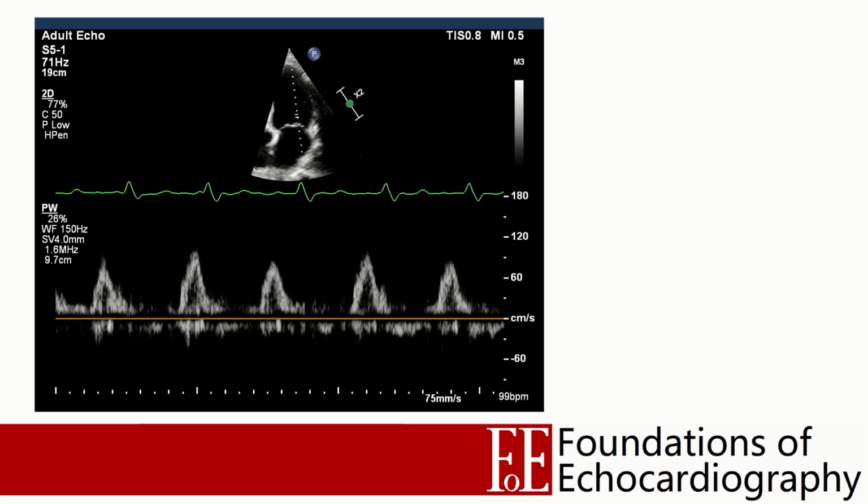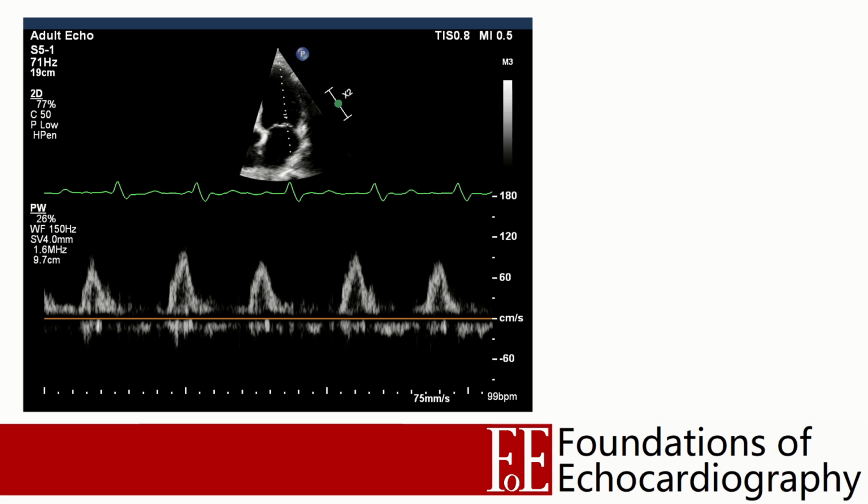In addition to losing slower speeds, we might also be missing greater velocities. If our intention was to detect the fastest velocity that occurs, then if our sample volume is not in the perfect spot, we might miss it. As a general rule, when your priority is to know about the speed of blood in a specific location, then you should use pulsed wave Doppler. When your priority is to identify the greatest velocity, irrespective of where it occurs, then you'll wish to use continuous wave Doppler.